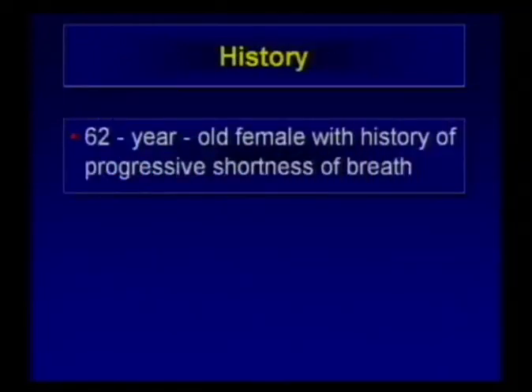62-year-old female with progressive shortness of breath. Here's her chest radiograph. This is one of the reasons high-res CT took off is, do you want to call this reticular, nodular, reticulonodular? Who knows? Pick something and work with it, and as long as you can justify it by pointing to a linear or nodular element on the chest radiograph, then you're right. Get 3 people in the room and you'll have 3 different ways of looking at the radiograph.